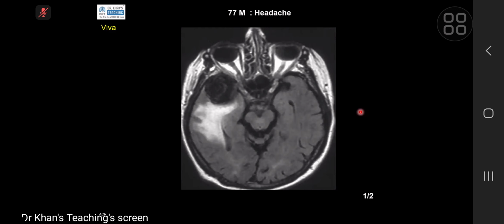In my case, the anatomy was quite unusual, so that is why I started with the CT. I could have simply started with the MR, and it will give you bizarre signal intensity. And why? Because part of it will be thrombosed and part of it will not be thrombosed. And then the flow inside will be of various velocities.